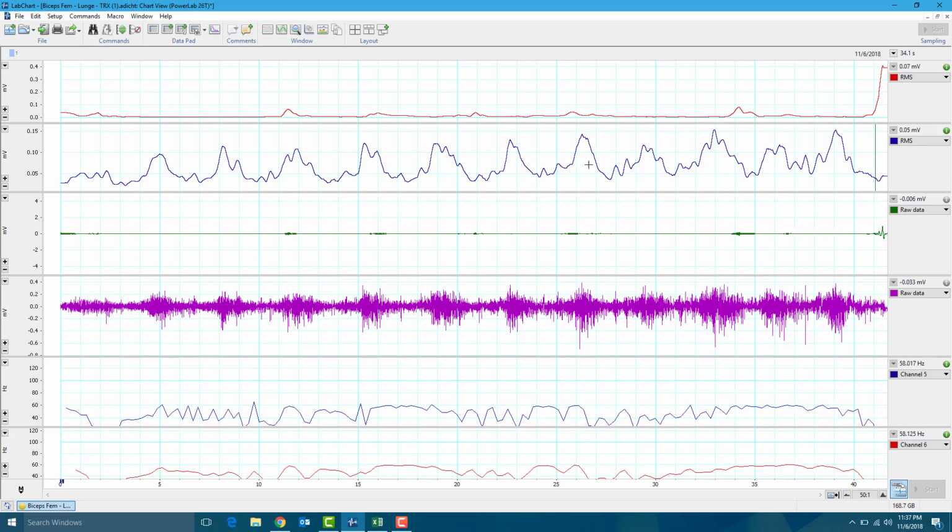I would slide it along starting, I guess, at rep 1: 0.06, 0.10, 0.11, 0.11, 0.12, and you would go along and do each rep like that.